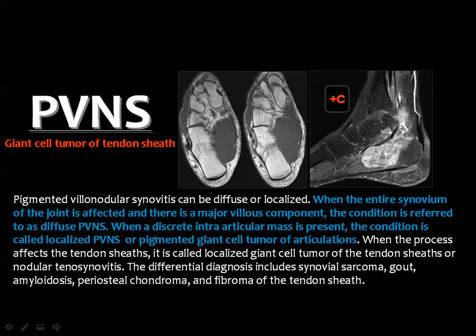Another example, and you see here there is a mass in the tarsal tunnel with low signal in the T1 and mixed contrast enhancement in the T1 fat set after injection of contrast. Then you may have to read this statement.